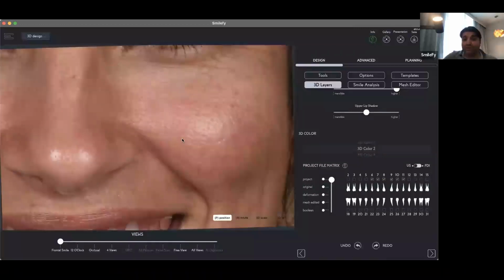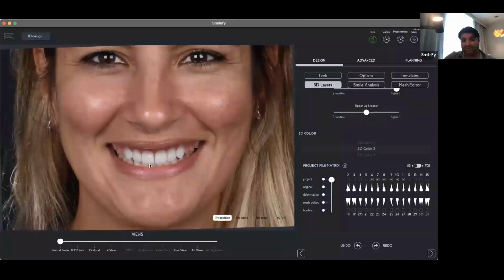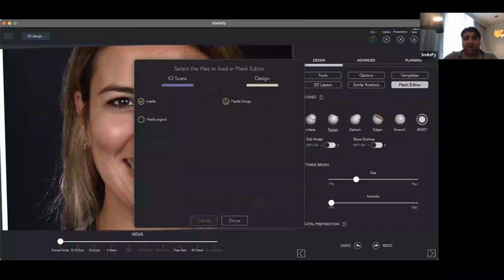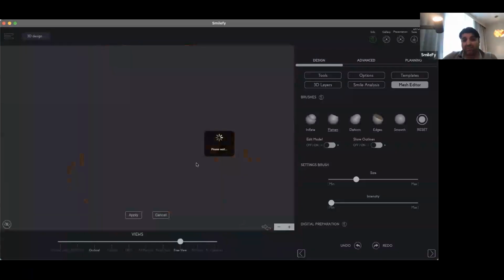Also, very, very important is the fact that we can click on the tooth and in the face, we can change, you see, the position of the 3D design, lingually, buccally, and so on. That's also helping in designing facially driven. When the patient is interested, of course, in the mock-up and in the design, and the patient confirmed the templates and everything else, we can now prepare the mock-up by just deleting from the bite the whole excess of the material, and then create a mock-up like veneers.